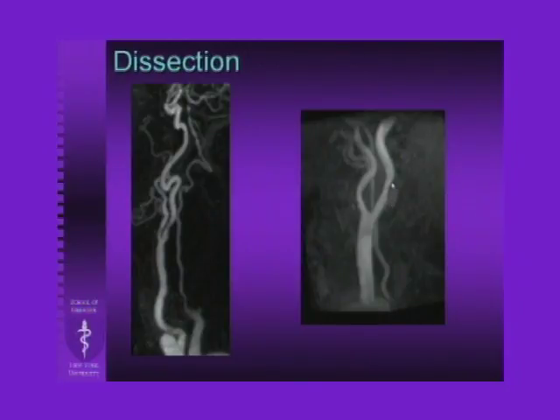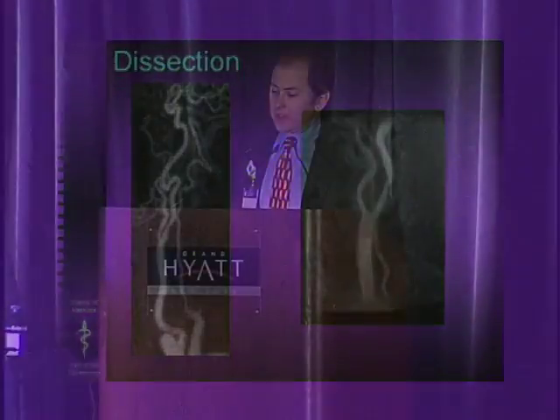And here's the hemorrhage in the wall of the vessel, the thrombosis that's happened following the dissection. Now, quite frankly, would I have picked that up on the contrast study alone? No, I probably wouldn't have. But the clinical story swayed us in the right direction here.